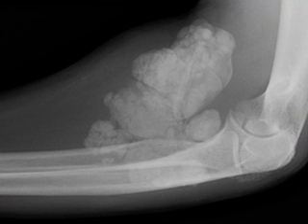This is an example of tumoral calcinosis around the elbow. You can see that there are these large, soft, rather flocculent masses which contain calcium hydroxyapatite, phosphate, and carbonate crystals in suspension. Frequently, if a radiograph is obtained using a horizontal beam or on CT or on MRI, there may be a fluid level demonstrated as the calcium crystals come out of suspension.